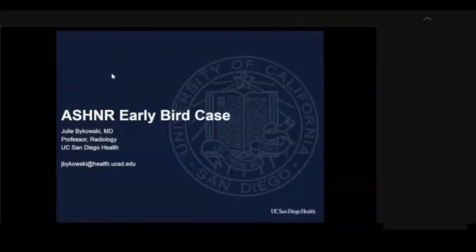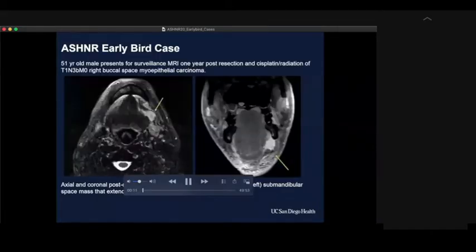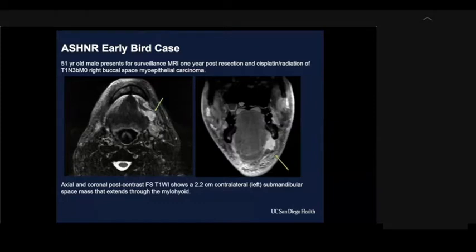Hi, this is Julie Bykowski. I'm faculty at UC San Diego Health, and this is my Earlybird case. We had a 51-year-old gentleman who came in for his surveillance MRI 1 year after a right buccal space myoepithelial carcinoma resection and adjuvant cisplatin radiation therapy.